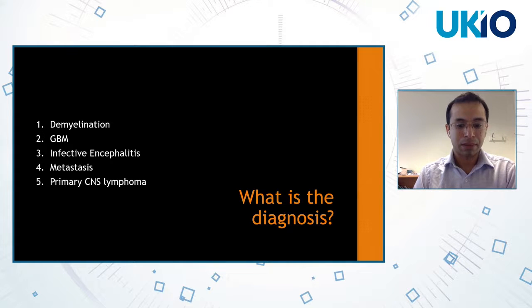There we go. Okay. On the CT scan here, we're seeing some hypodensity in the left parietal deep white matter. Very subtle, but it's there. Particularly if you look now at the MR in retrospect, there's clearly an abnormality there around the ventricular trigone, abutting the ventricle, and it's extending into the corpus callosum.